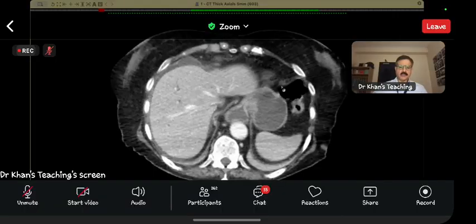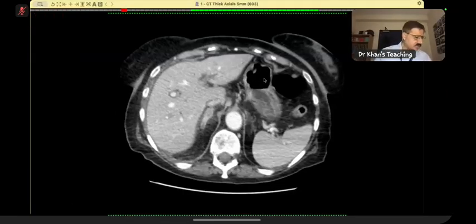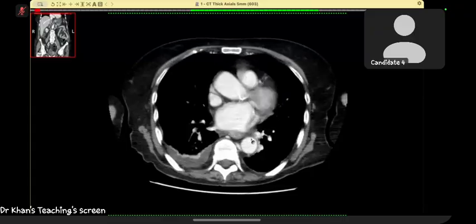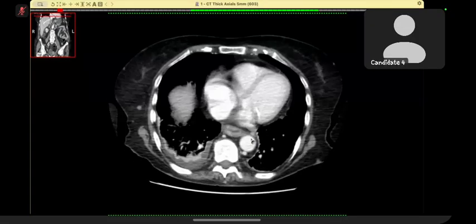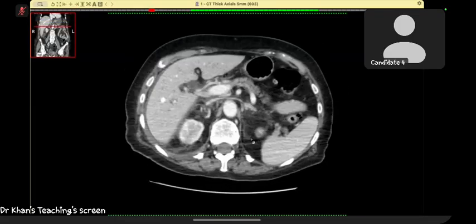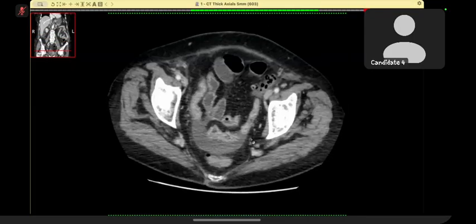An A&E case, acute abdomen. So this patient is an 84-year-old, came to A&E, classical acute abdomen, very tender, things like that. And over to you. Okay, I am presented with the CT abdomen, portovenous phase. This is a patient which came through A&E with acute abdomen. First, I will scroll through the whole stack of images. Then I will start commenting on my findings.